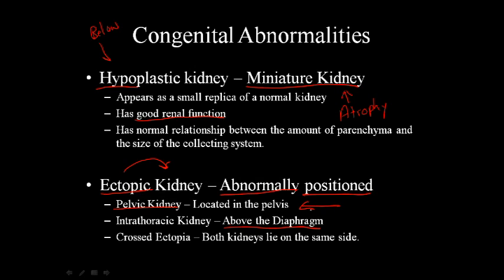But her kidney was also malrotated, meaning that it wasn't rotated like a typical kidney, but it was rotated the opposite of a typical kidney. Very strange to look at, but I imagine that an intrathoracic kidney would be one of the craziest things to actually see.